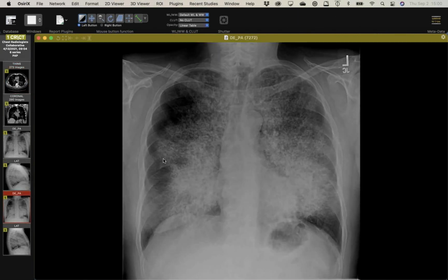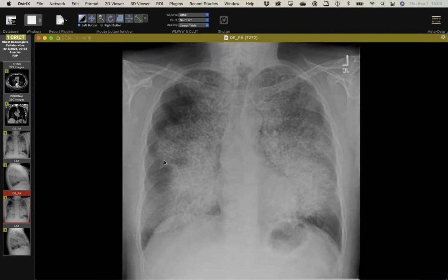I think they're developing fibrosis. We had a case I just saw yesterday of a patient who was transplanted for fibrosis secondary to alveolar proteinosis, and now they have recurrence of their alveolar proteinosis. Oh, wow. And I showed a case at Emory a long time ago, like the first year of our webinar, of a young pediatric patient who had fibrosis. That one didn't look quite like this, but on surgical lung biopsy was chronic alveolar proteinosis as well. So I wonder if they're just developing some fibrosis.